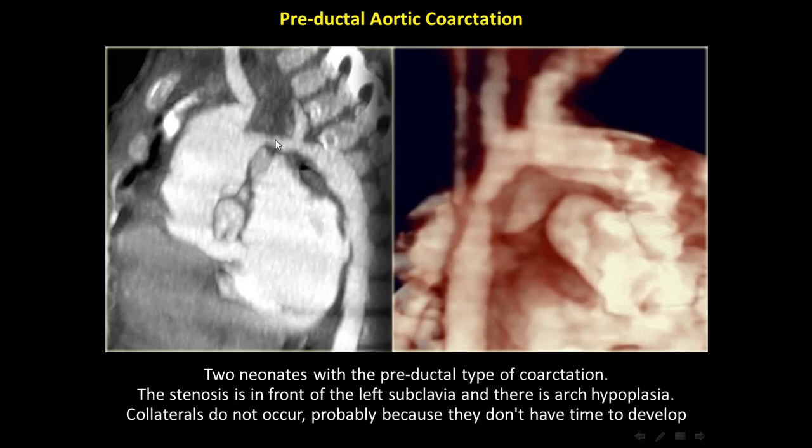Where is the subclavian reduction? This one. The one you showed, the small one, is the subclavian. It says proximal to subclavian. Yeah, proximal means more near to the heart, more near to the origin of the aorta.